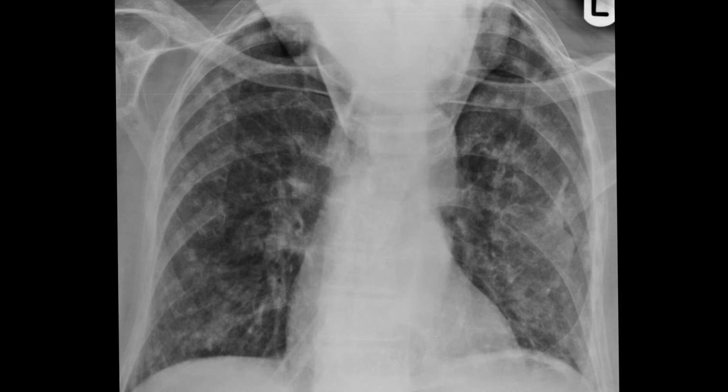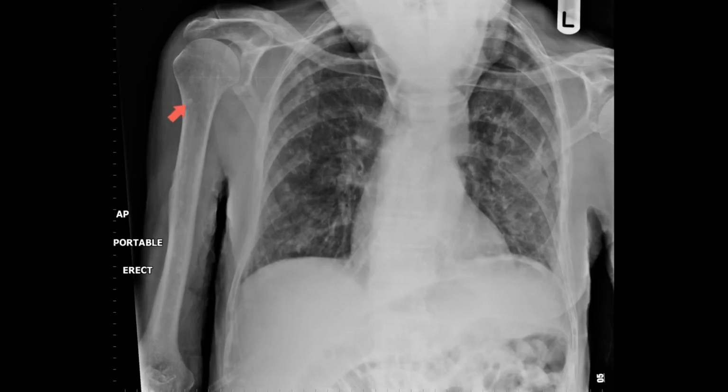On first impressions, looking at this chest radiograph, it looks as if the patient has multiple pulmonary lesions. But actually, if you look at the diamond, there is no lesion projected in that diamond space. And the lesions are only seen where you have bone. The important thing to remember is to look, and you can see that there are sclerotic lesions outside of the lung fields in the bones, and none of these lesions are purely projected over the skin. So this is a patient who has prostatic sclerotic bony metastases.